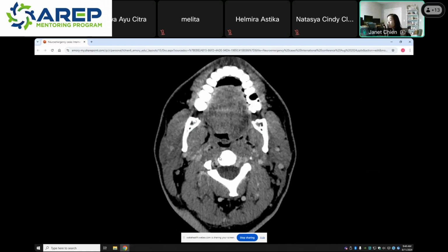Oh, so the air in the prevertebral space, that's actually just air in the aerodigestive tract. I will let that go. I want you to focus on this finding here. What do you think is going on there?